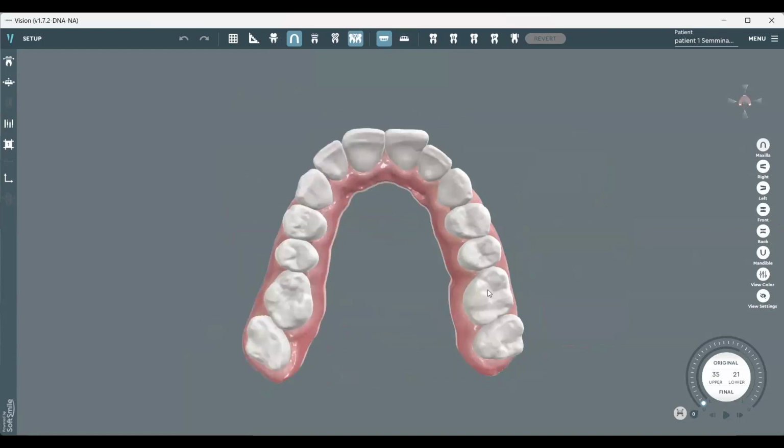Derotation of 6. This is going to open a space to do retraction. Always the derotation of 6 is going to open a space, especially here, because it's very rotated. When a molar is rotated, it needs more space, right? If we place it in correct position, we are going to win space.